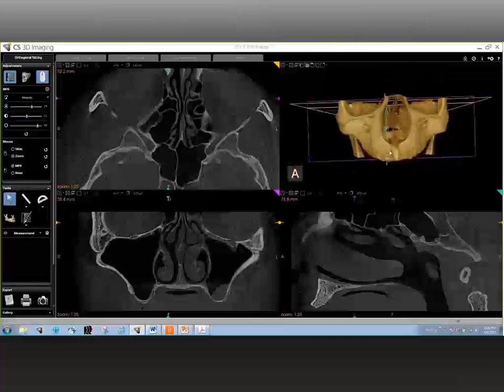It could originate from the jaw and then kind of transmit itself into the sinuses, or vice versa. That could happen the other way around too. So by understanding the sinus health, you are able to make sure that you are treating the right disease of the jaw. So, of course, with diagnosis being of utmost importance, you're trying to clarify or bring attention to the fact that some of the diseases of the maxillary jaw can be mistaken for sinus disease or vice versa. That is correct. That is absolutely correct.